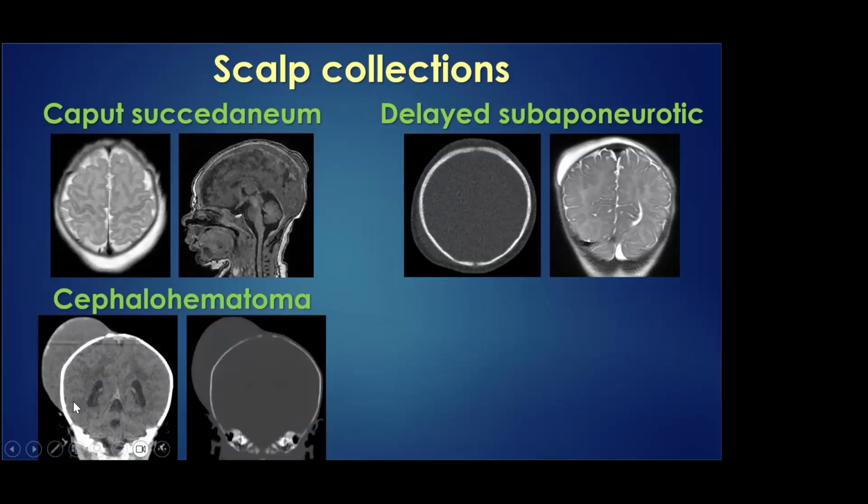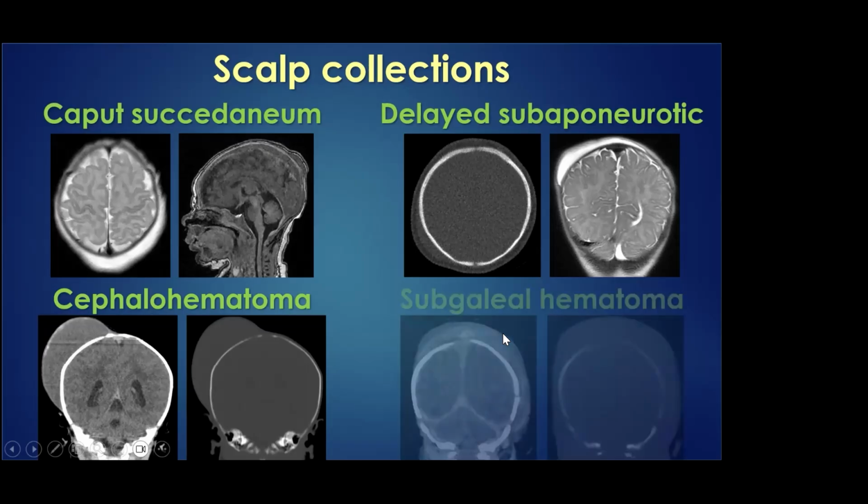Cephalohematoma, so this one is actually limited by sutures because it's actually periosteum. You can see that there's some mineralization of this. It's actually that outer layer of the periosteum being uplifted, and the hemorrhage is going into that space, right? And so these can actually ossify and become part of the skull and just become an asymmetry. But again, you see that thin mineralized layer of periosteum, and they basically are delimited by sutures. So coronal, squamosal suture, sagittal suture, they do not go beyond.